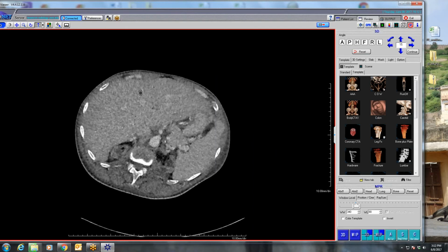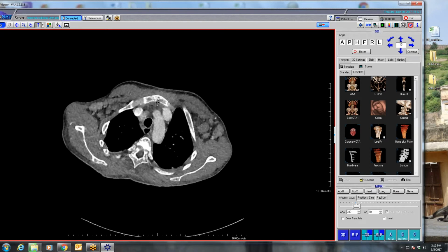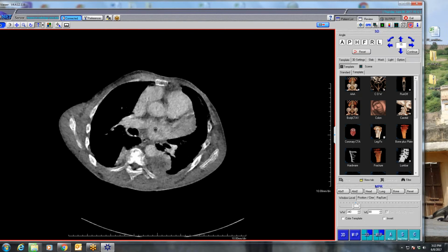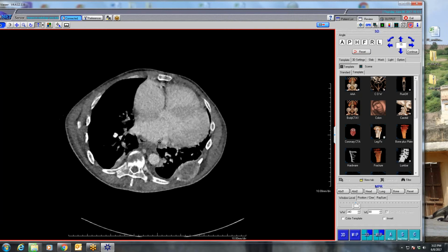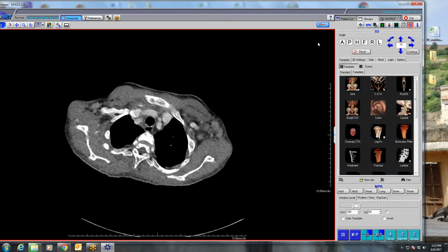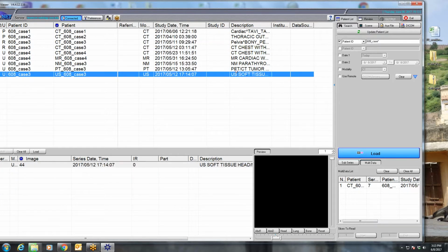He's clearly a dialysis guy. He's got no kidneys, and he has all these masses. He's got bulky adenopathy. So I was thinking this was, I don't know, lymphoma. I know the bony lesions are a little atypical, but I just figured it'd be simple bony mets from something. And so they went ahead and biopsied these things. Anyways, I'll show you, I have the PET.